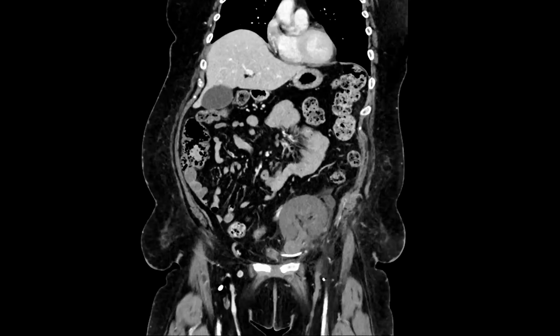I have a question though, because the EOVIST doesn't always go into the gallbladder. Do you know what I mean? Say it just went down the right biliary tree, you still might not have the answer. Well, either way, at least the CT definitely helped, I think. Yeah, good call.